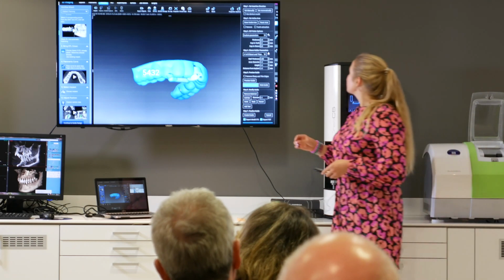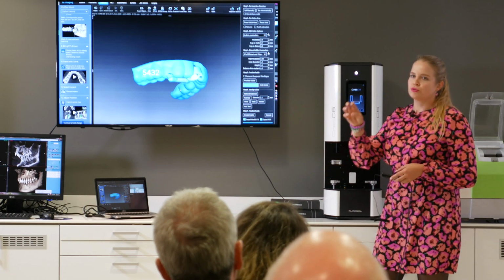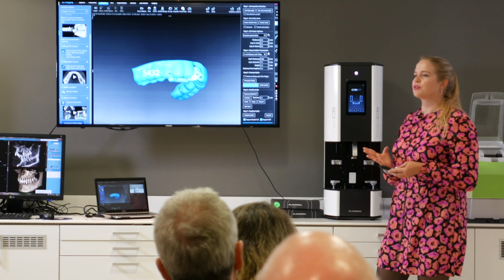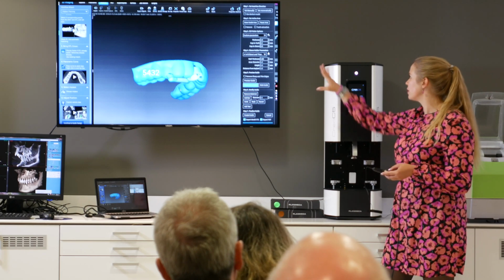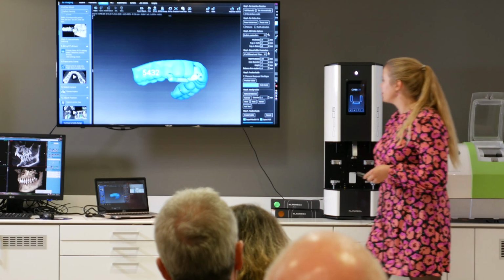And what is also included is like a tooth extraction. So if we plan to extract a tooth and replace it immediately in the same operation with an implant, we can design the guide so that we can do everything during the same operation.